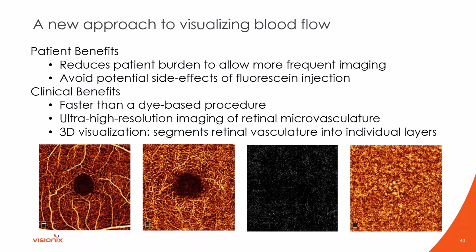Is there any capillary dropout? Is there enlargement of the foveal avascular zone? Is there any abnormal NVE, NVI, NVD? Is there any neovascularization? Again, the patient had to get an injection into the arm for the fluorescein angiogram, which is a little bit more invasive, and it took some time to be able to do that.